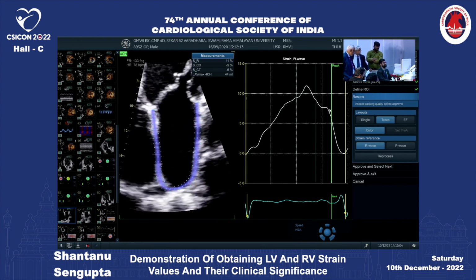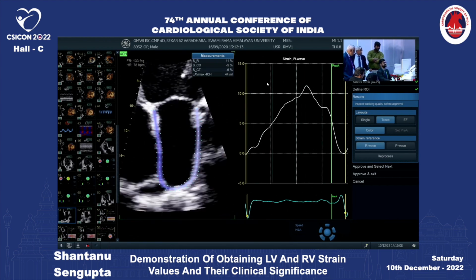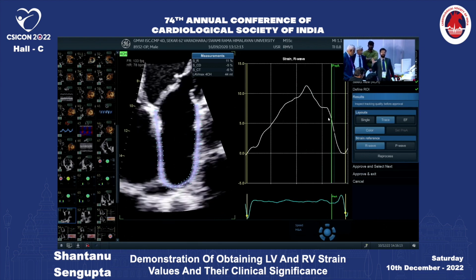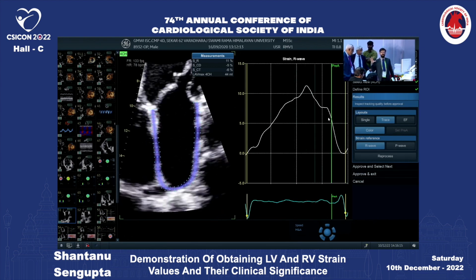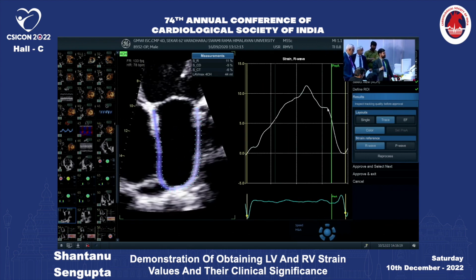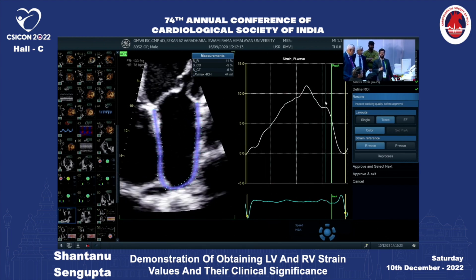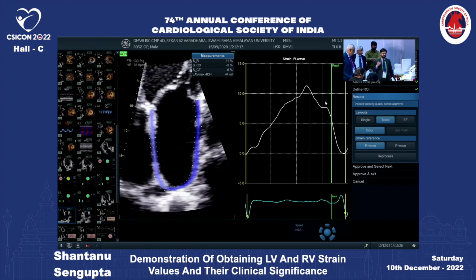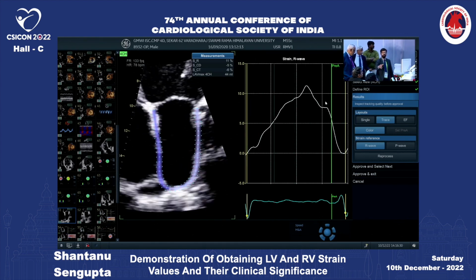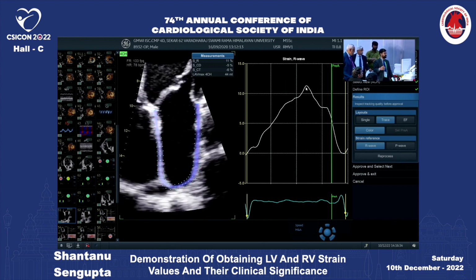The second is PACS, around -6. PACS is peak atrial contractile strain, also called the booster strain, when the left atrium contracts. Normally it is roughly 17%; here it is around 6%. The difference between the two is called the conduit strain. For research and for all practical purposes, for the patient we were discussing, all we need is this PALS, from here to here, which is 11%.